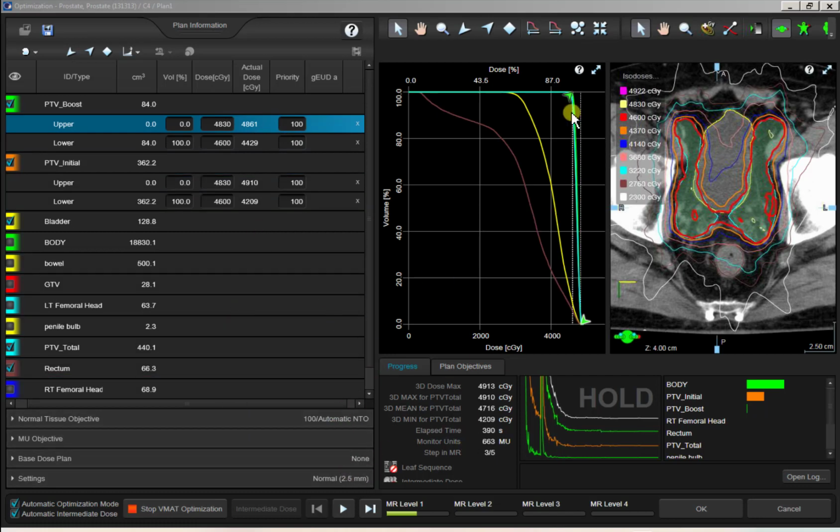What that tells me is that we need to change our beam arrangement. So if you start this way, it's a really good indicator of whether or not your beam arrangement is going to be okay. All right, if it does not look good after this, you messed up your beam arrangement somehow. Either your collimators or your jaw settings, something with your beams needs to change, okay? It should look perfect conformality and coverage-wise right now, okay?